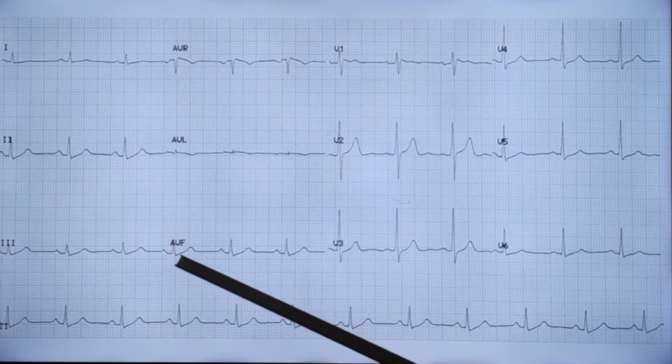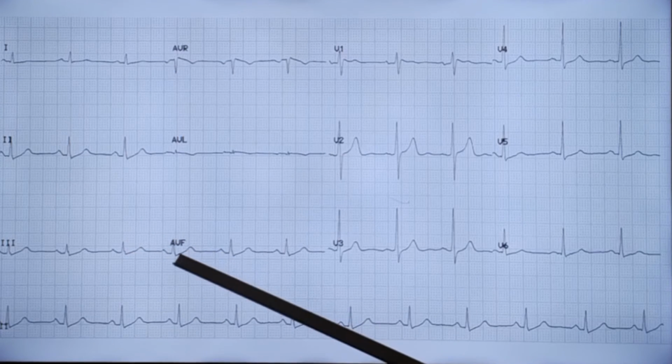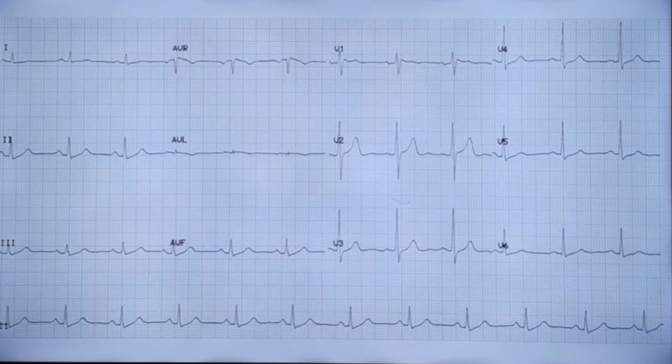This pattern is due to the presence of the TA wave, atrial repolarization, which is not evident here. And even though we say the ST segment is isoelectric, most often it is not isoelectric. It is slowly upsloping and merging into the ascending limb of the T wave.